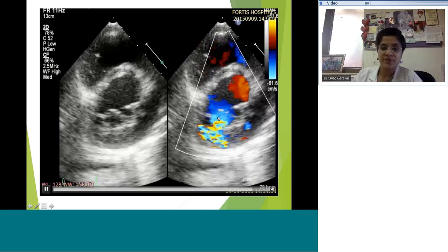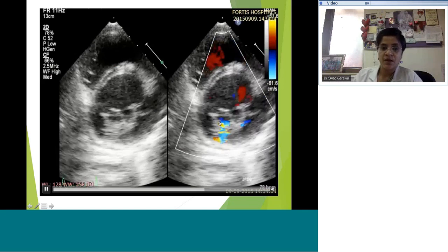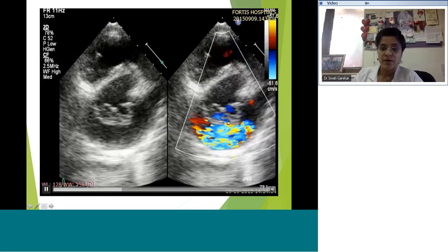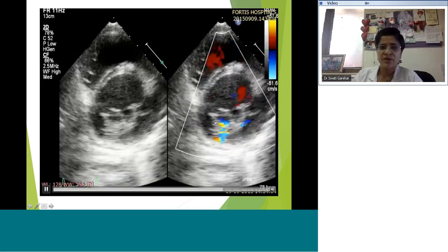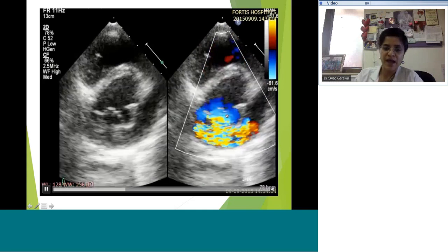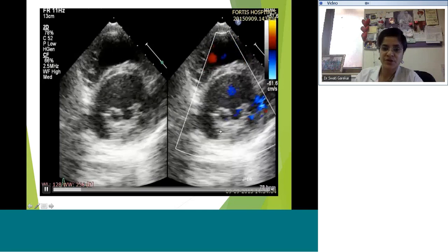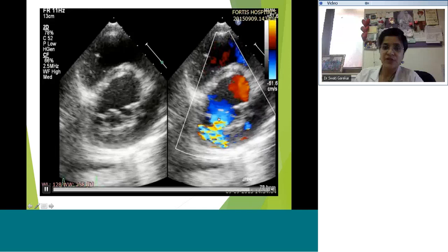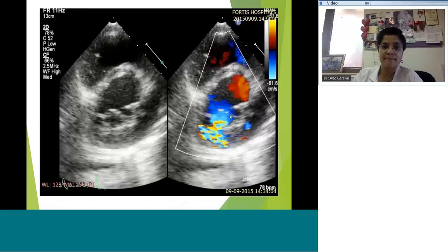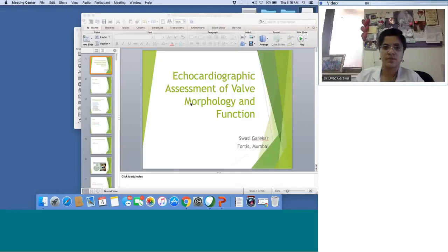Please do interrupt me if there are questions. So you see that the regurgitation is actually all around the opening where the anterior leaflet coapts with the posterior, and especially around the A2. Kavita, we can keep the chat window open if there's anybody with a question. Just a second.